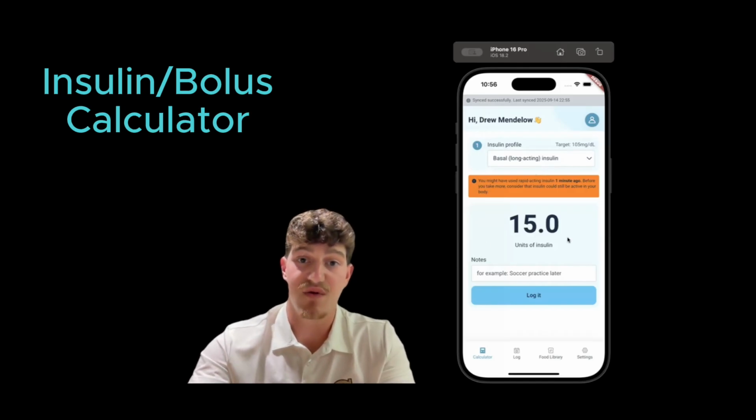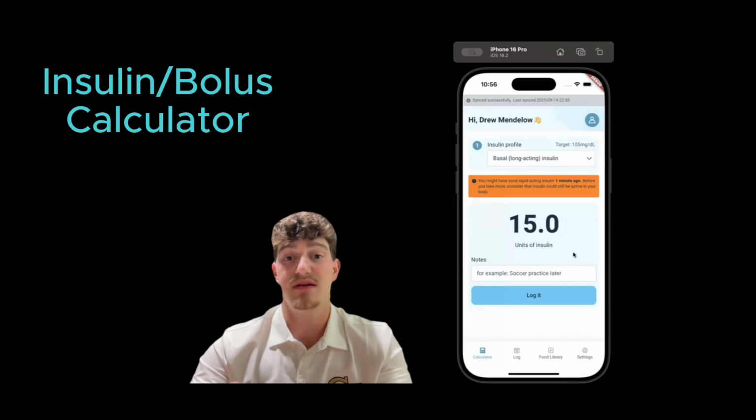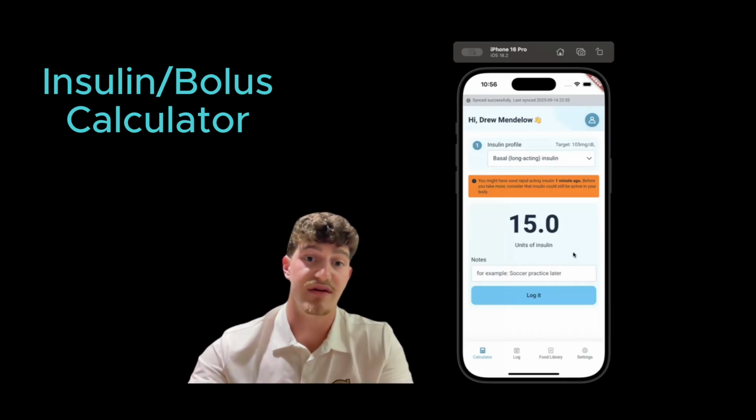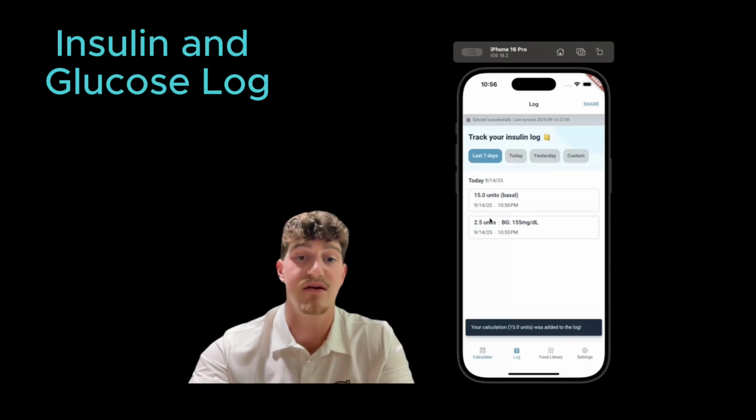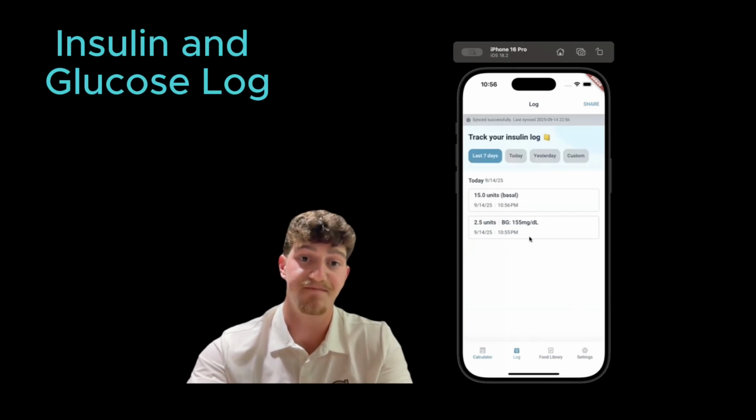And you can add notes as well, but this is just a place for you to be able to log it and have it with all your other data. So I can say log, and now you can see the basal insulin is logged with all my other boluses.